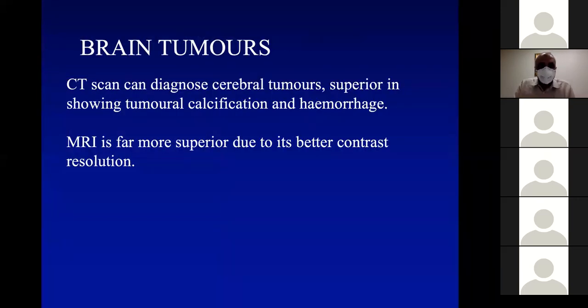Now coming to brain tumors, CT can diagnose cerebral tumors, superior in showing tumoral calcification and hemorrhages. MRI is far more superior due to its better contrast resolution. I'll show you some examples.